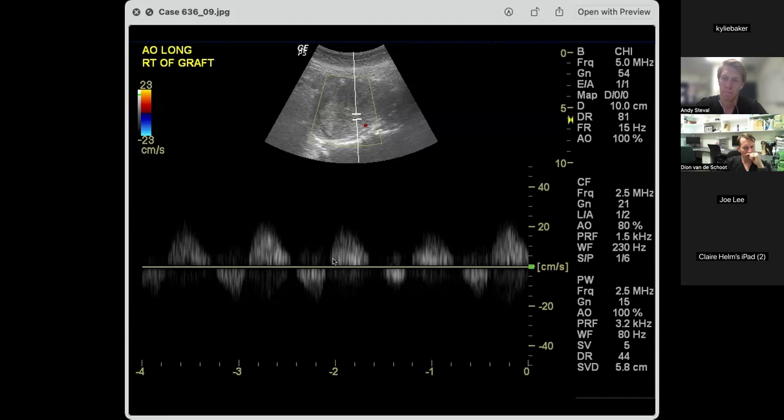Yeah, so this was a type 2 leak, and it's actually uncommon on ultrasound to be able to see that with color Doppler, because the sensitivity of color Doppler generally is not high enough for those small, slow leaks. And we see that both when looking for endoleaks, but also other things where you're looking for small amounts. Contrast is much better.